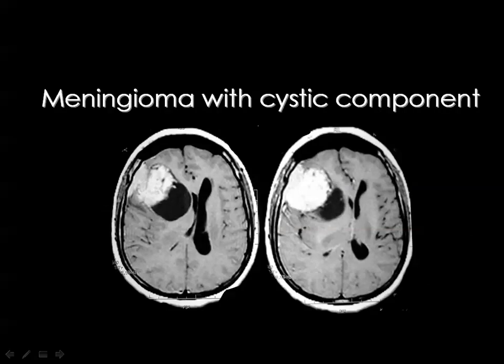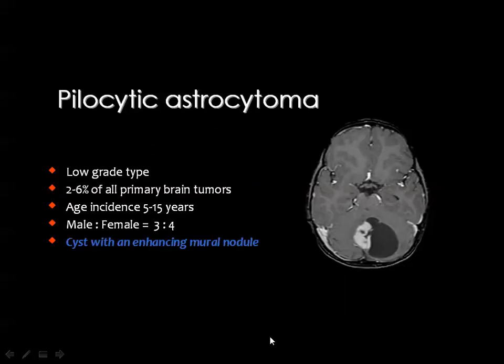Then you remember from the lecture of brain tumors, we have mentioned something about the meningioma with a cystic component. And the meningioma is a homogeneously enhancing lesion based on the dura, and sometimes it may have a cystic component which is capping the tumor itself.